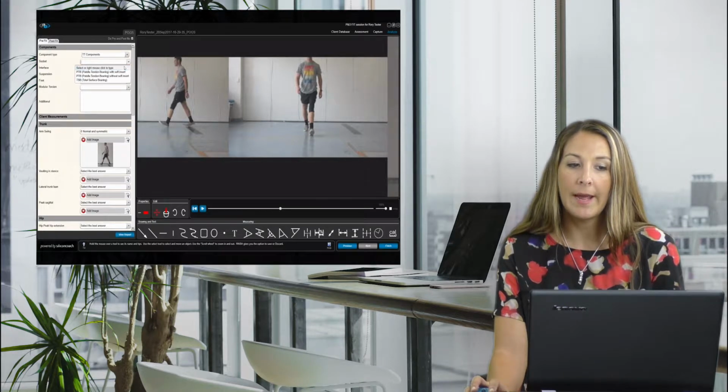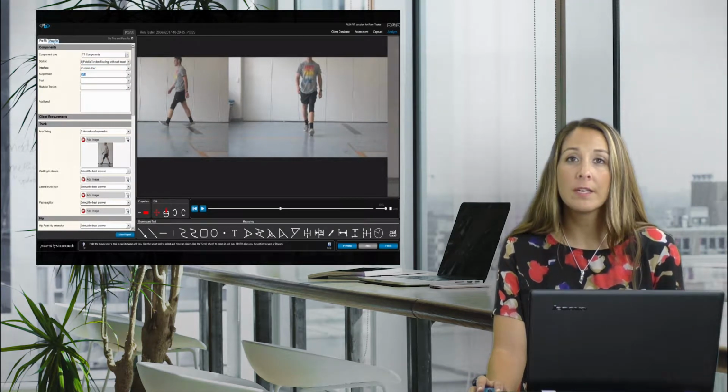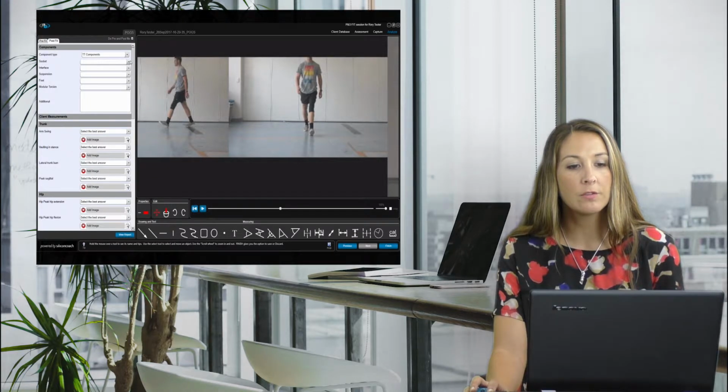You can add for the previous. We've got lots of different options that we can pick. And then if we want to compare an intervention, we would go over here and do the same thing and pick our different options based on what they are using.